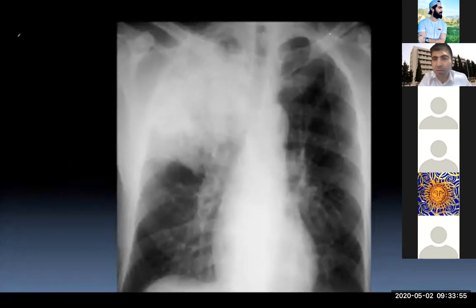So what about this chest X-ray, Janan? According to our system, Janan, can you hear me?